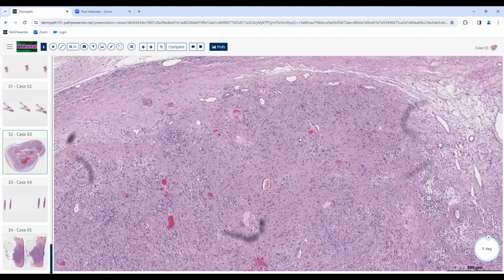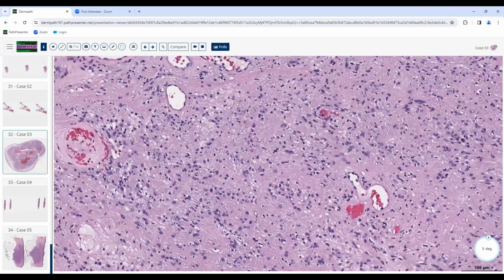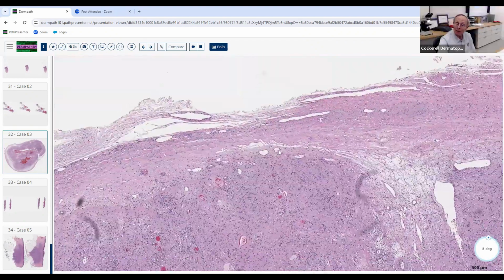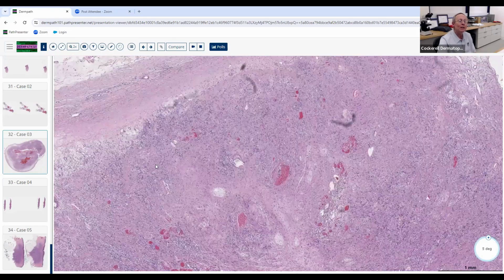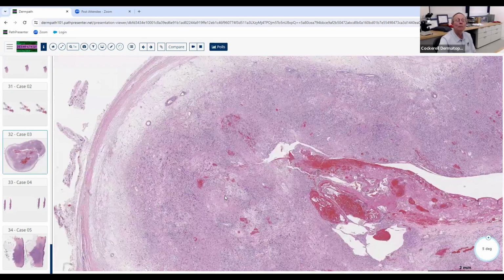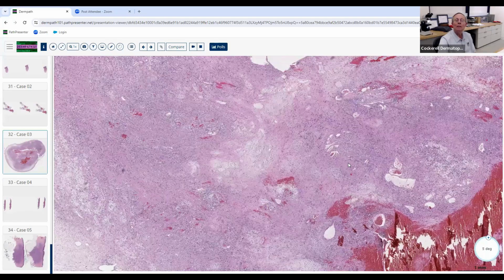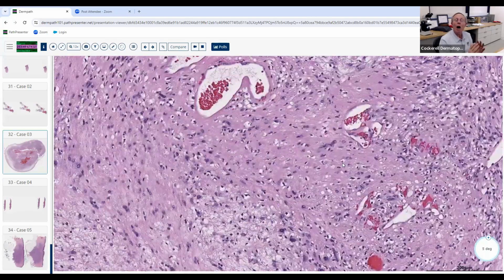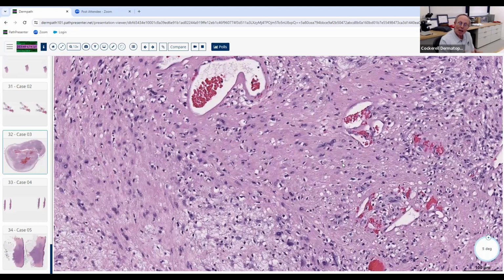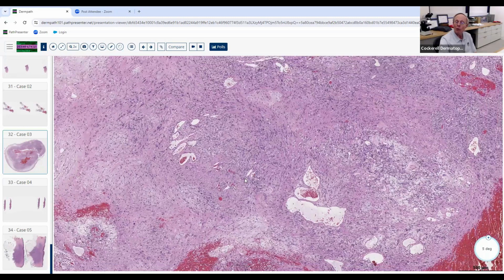All right, so I'm going to spot you and tell you this is neural. Okay, I'll take your word. So which type of neural then? Once we're neural, benign, we don't have too many of those either. So what's the most common benign neural? Neurofibroma. Yeah, by far the most common. So that's Schwannian. What's the second most common Schwannian tumor? Schwannoma? Yes, that's what this is. This is a schwannoma or neurilemmoma, another name for it.